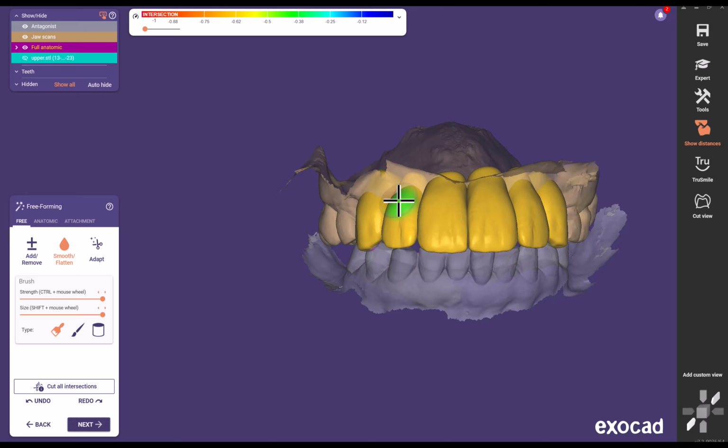But what I don't know most of all right now that's limiting me is any kind of a reference for midline, occlusal plane, and as if you're functioning as the lab, labs deal with this all the time. They get not enough data sent to them, and so if you can get that data, do it, because that's much more precise. But we don't have that currently, and I don't have time to get it. I'll have to refine this when I'm down there. But what could I use?